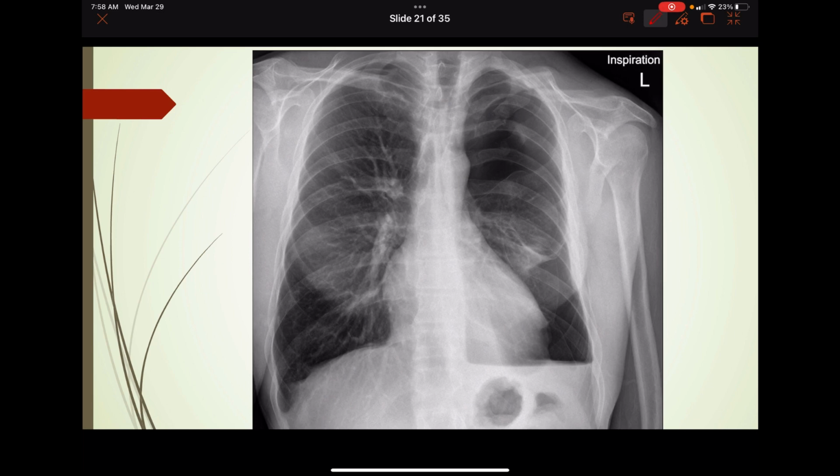yeah, you know, the more that I look at it, that's a clavicle. You can see the clavicle right there. Here's one end of the clavicle, and here's the other end of the clavicle. So yeah, that's a clavicle fracture, then the ribs are behind it. But it still looks like there may be a fracture here in this rib. So it looks like a clavicle fracture, and then maybe a fractured rib right there, which looks to be either the second or third. I think it's probably the third. I think this is second here, second rib.